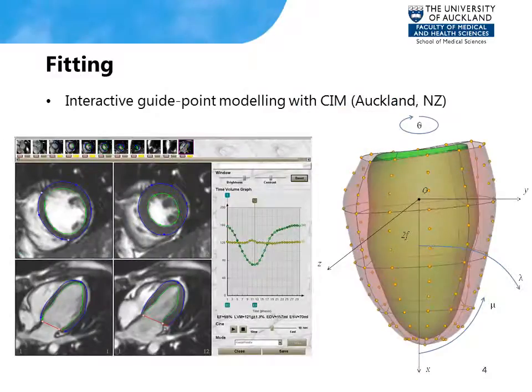To align everybody to the same map or template, we use customized software to fit a finite element model of the left ventricle to the MRI images. This is done in a standardized fashion and provides a mathematical representation of the endocardial and epicardial surfaces throughout time. By using some fiducial markers at key anatomical positions, point correspondence within a small tolerance is guaranteed. The finite element model is written in prolate coordinates by means of Bezier parameters which capture the specific shape of each patient.